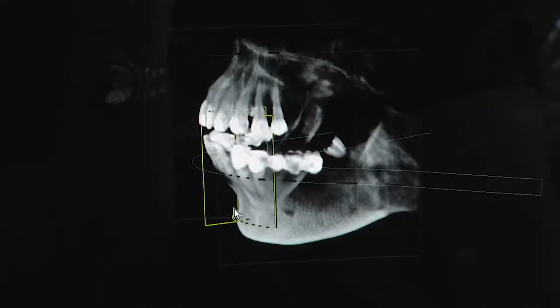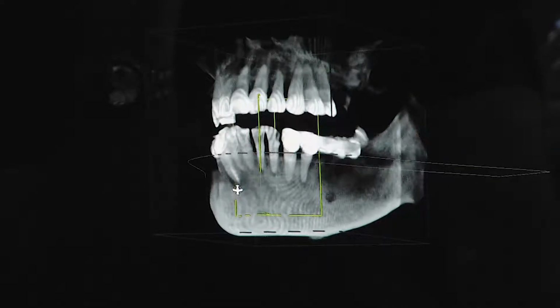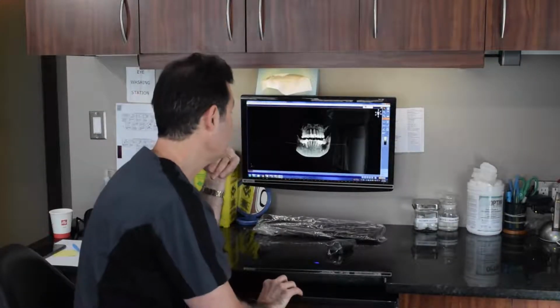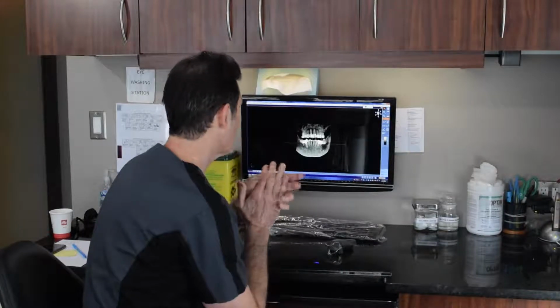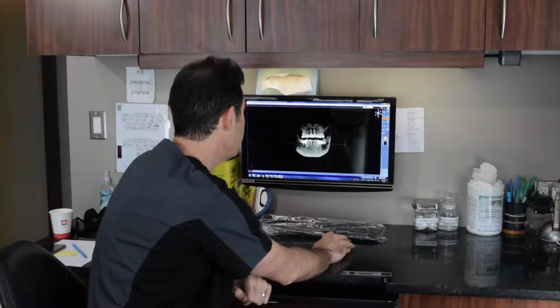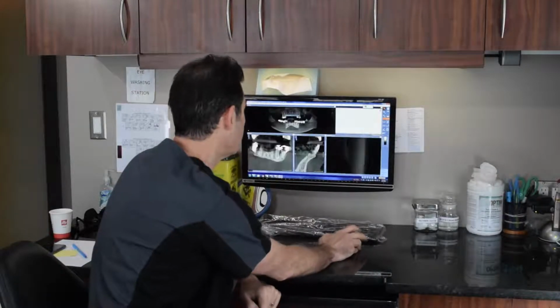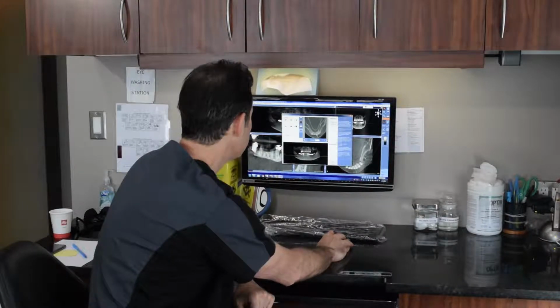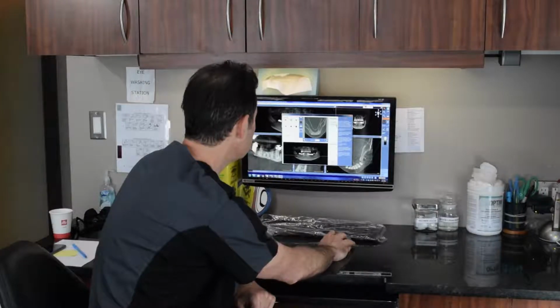Generally this is a view that patients like to see, but it's not a view that we tend to work from in the field. We work from a series of two-dimensional views that give me all of this information so that I can work with it. So if we take a look here, I'm just going to reset the positioning here of the bone.